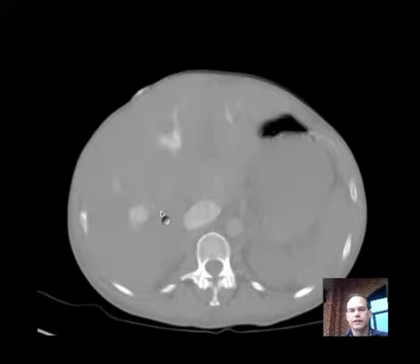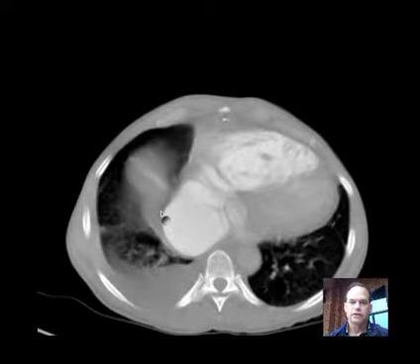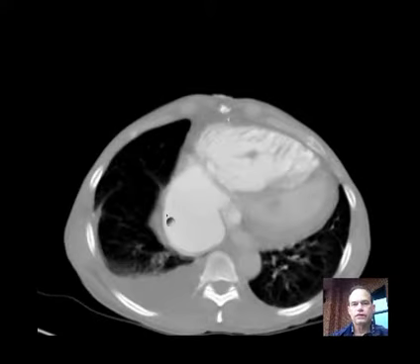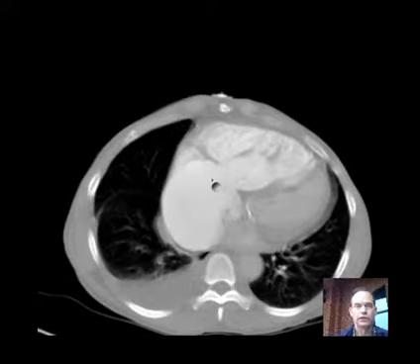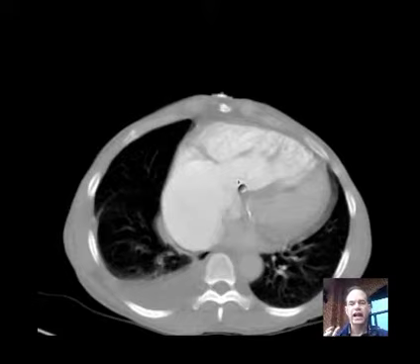Okay, what could be causing that? Well, this is a good depiction of right heart failure. This right side of the heart, for whatever reason, and you know that there's been some valve problems before, and that might have put the heart over the edge in terms of its ability to contract. But the right side of the heart just cannot pump out the blood that's coming to it as fast as it needs to. And maybe you've heard about the Starling law, which is that a ventricular contraction ability depends on how much distension of the ventricle there is.